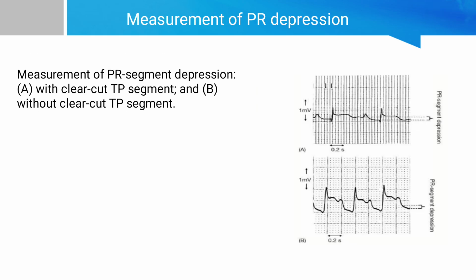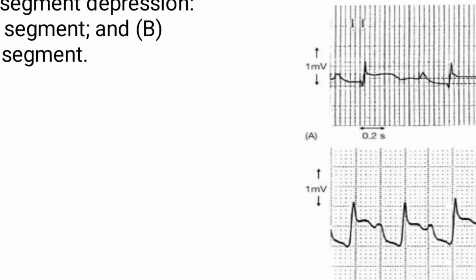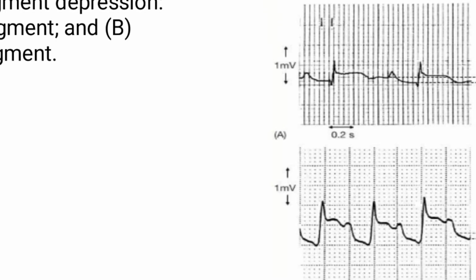How do we measure the PR depression? Just see how we calculate PR segment depression.